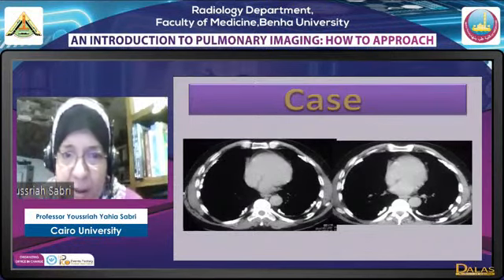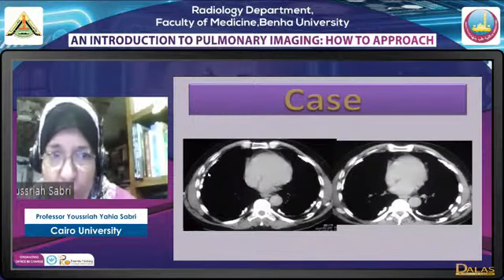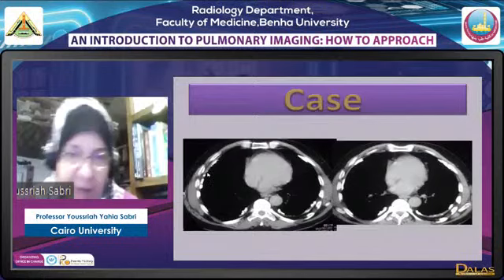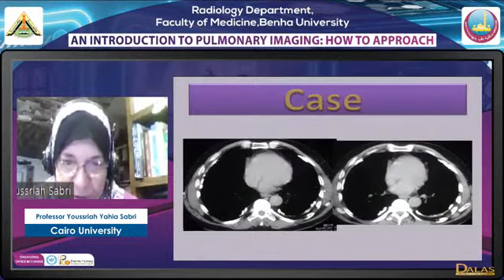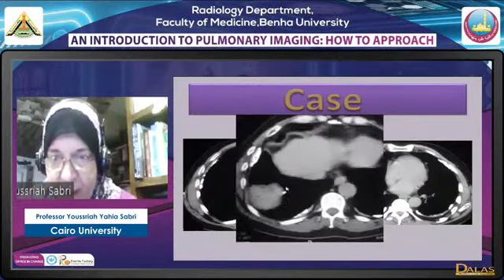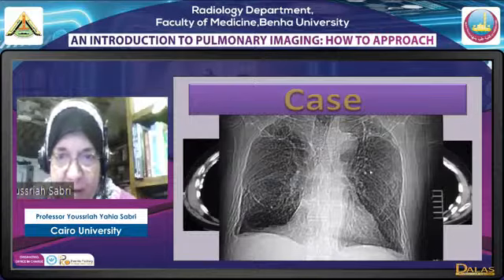You see these, they mean nothing. They are not interstitial fibrosis. They are only pleural plaques. It is called asbestos exposure. It may be associated with other lesions later on, but by itself it is not. Bilateral pleural plaques with calcification and diaphragmatic calcification is asbestos exposure. And this is how they will look in the scanogram.